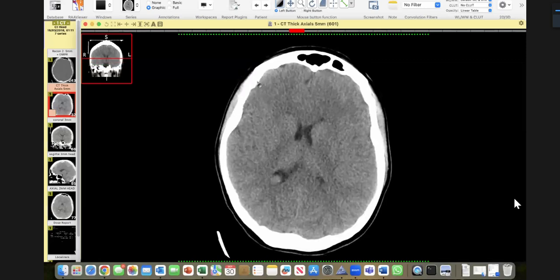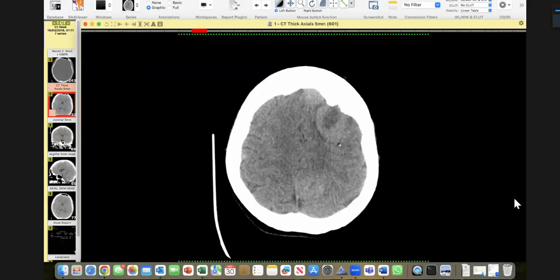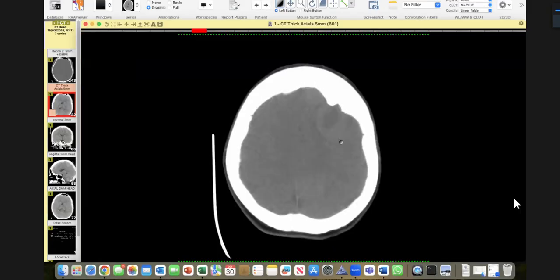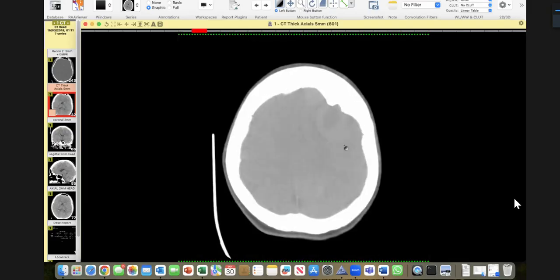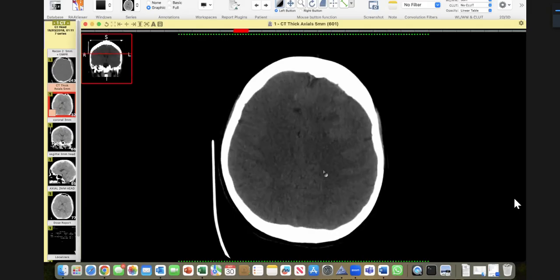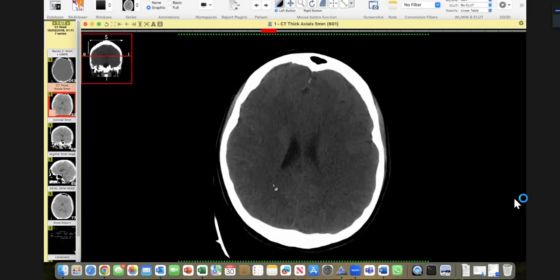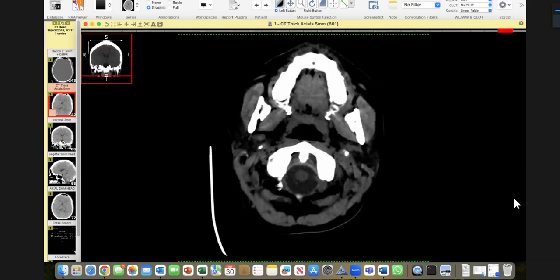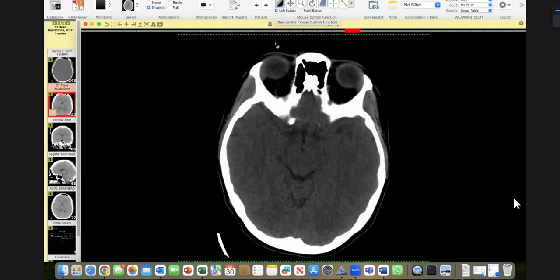Having said that, here you picked up the meningiomas, which was fine. You could have asked for a bone window, because is there some hyperostosis here? And there was a bit of hyperostosis in this region. Now, this is in the ventricle. Actually, you did mention it in the end because I was asking a leading question, but at that time it was not projecting for you.